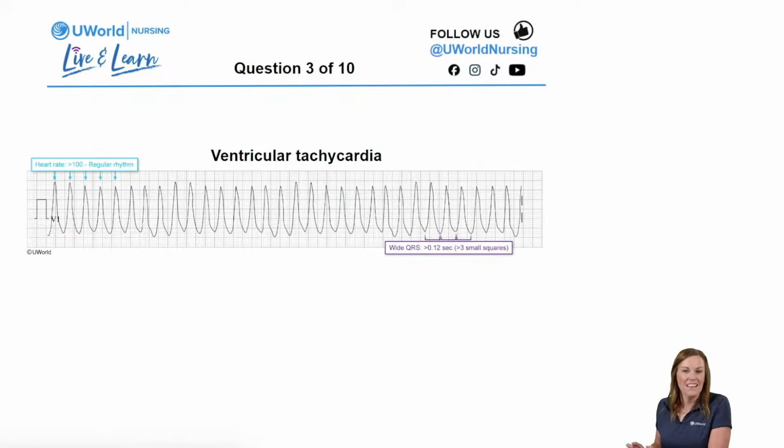All right, so our correct answer is ventricular tachycardia. What you guys are seeing is the ventricle taking over as the pacemaker of our heart in this situation. We're seeing just ventricular activity, just the QRS complexes, a lot of R waves. We have an extremely high heart rate happening here, and we have a widened QRS. We talked about on Tuesday that our QRS complex should be less than 3 squares. QRS is 3 letters, so think of those 3 small ticks. What we're seeing here are widened QRS complexes and no atrial activity. So that's how we know it's V-Tach. But you guys did great.